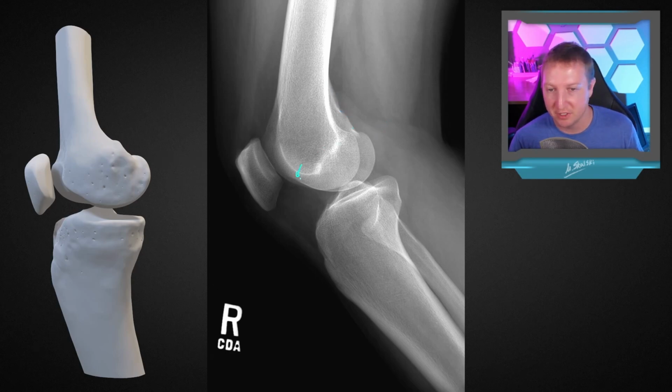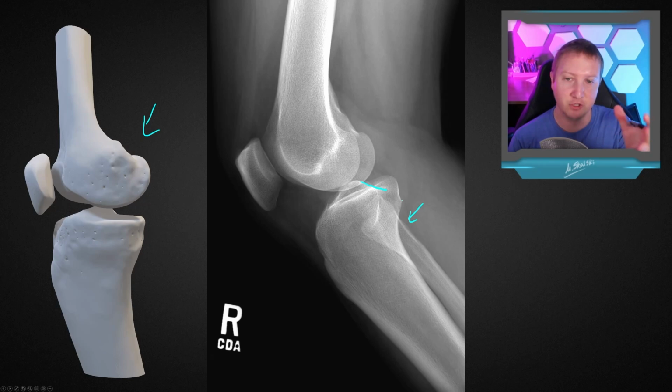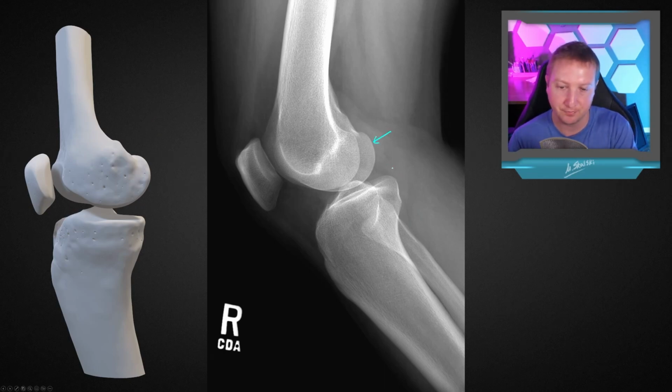And again, this is a different individual. They also have a slight condylopatellar sulcus there, and maybe we even see that sloped portion behind the tibial spines a little bit better. And we know that they're oblique this way because of that anterior movement of the fibula, which shows you how that rotation is occurring. If the fibula was projecting more posteriorly, then we would be seeing the lateral femoral condyle projected more posteriorly here.